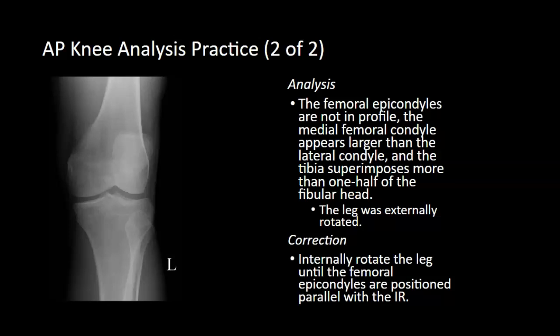Now we need to determine, is there any rotation? With that being said, you want to look at that tib-fib relationship, and it's starting to get superimposed.